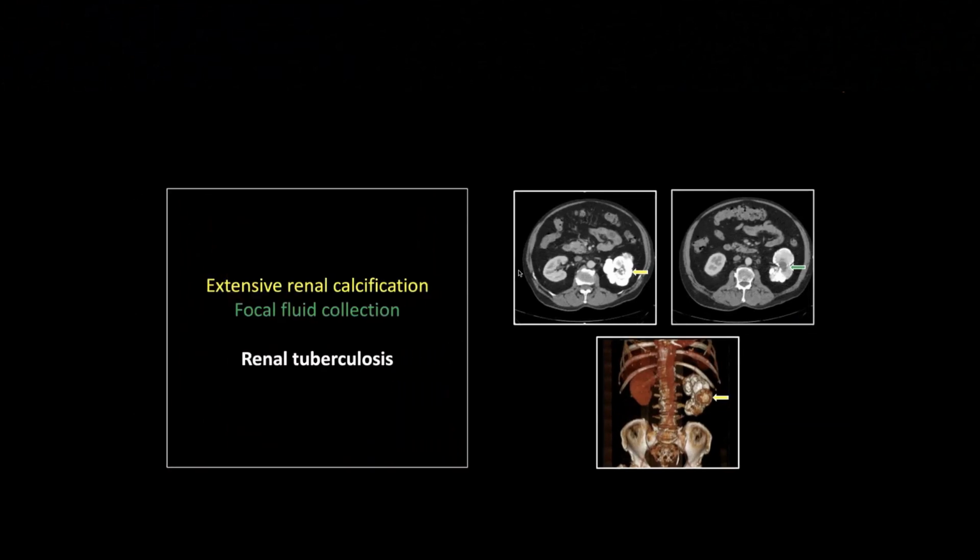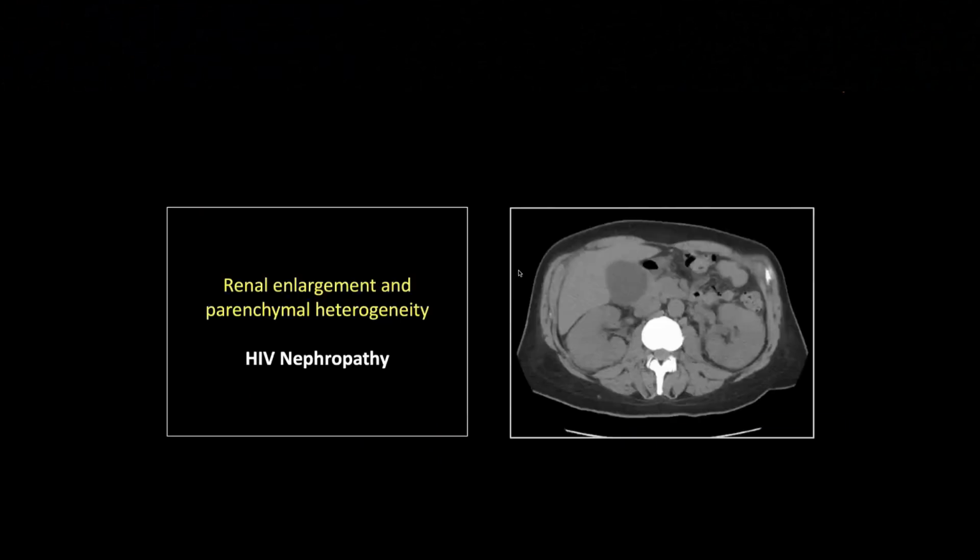All right, renal tuberculosis. This is one I've seen with some frequency. And the disappointing thing is it's always done non-contrast because these patients typically do present in renal failure.